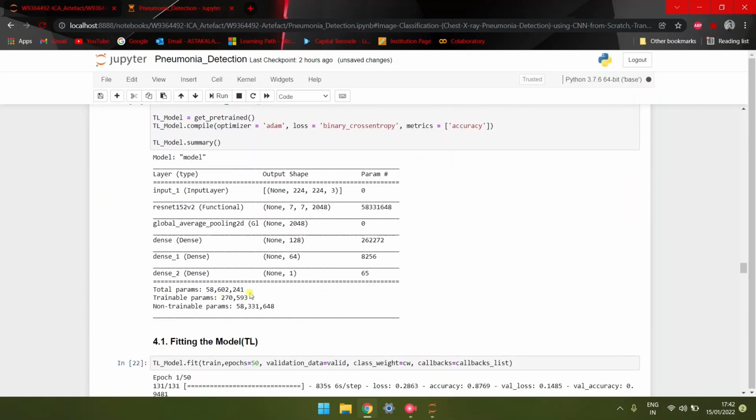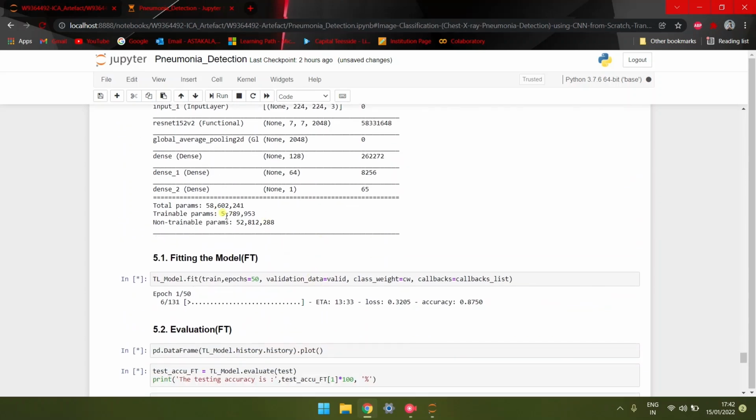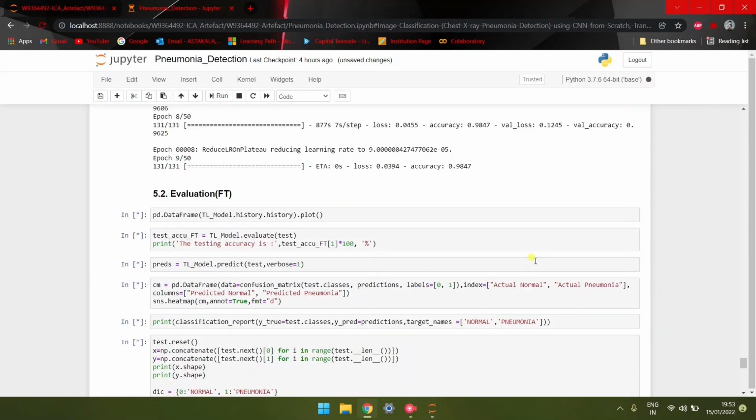the step which we did in this model 3 is that we unfreeze the last 15 layers of the pre-trained model, which brings a greater change in this model. Compared to all the three models, fine tuning has obtained the highest accuracy. The training process is similar to what we saw in model 1 and model 2.